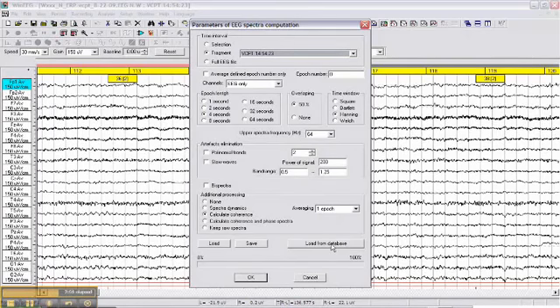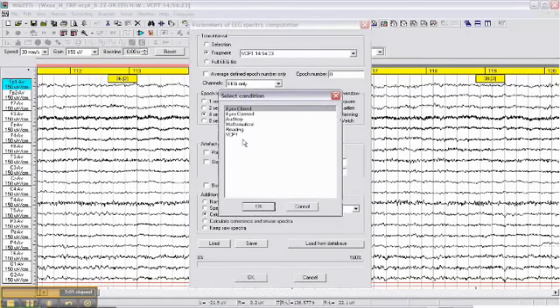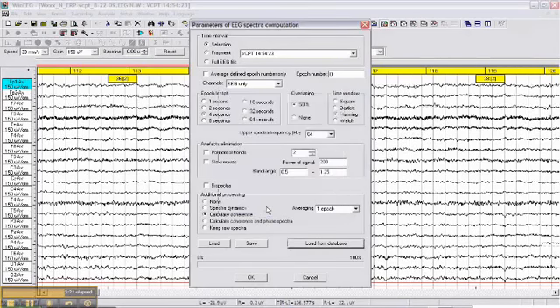If you're doing the analysis the first time, load the parameters from the database. As you can see, there are different task conditions, but the parameters are basically the same for all task conditions. So it doesn't matter from which task condition you download parameters. You can click just, for example, Visual CPT task, and that's it.